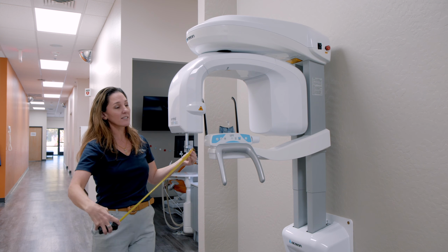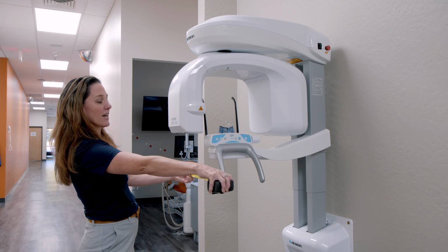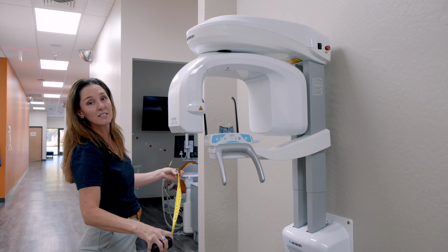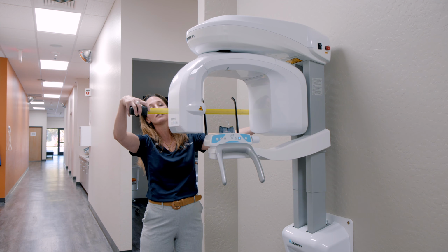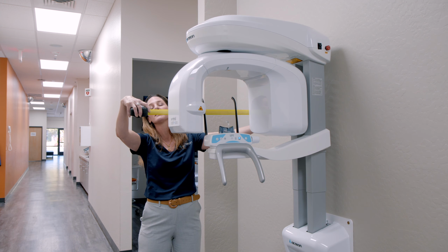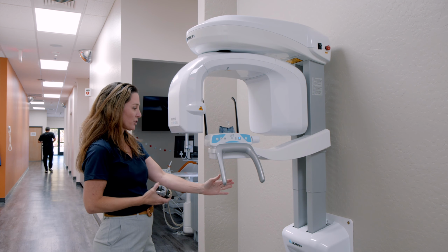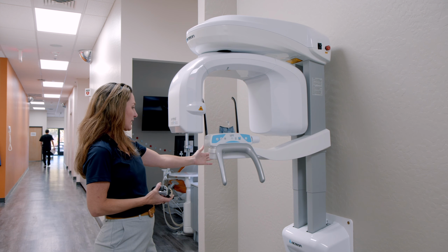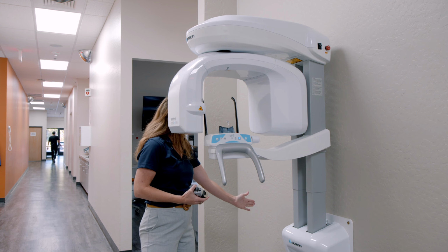From side to side, if I were to get the handlebars in play, I'm looking at about just shy of 17. And then if we're talking about just the footprint of our rotation of the tube head, and I'm measuring that, I'm just about 27 and a half. So as you notice here, if I were to put this unit on the wall, I could be as close as 24 inches from mid to the wall.